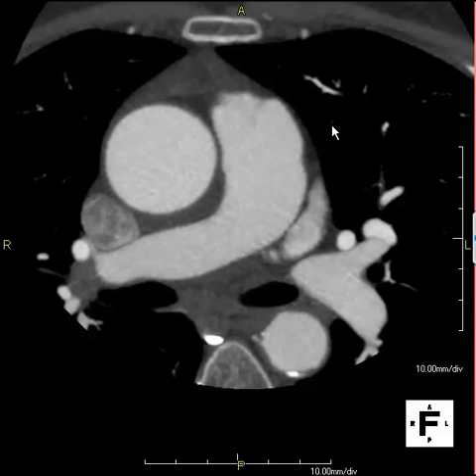This is case L3 Ct A67. The history is that of a 46-year-old woman who has been well during her adult life, but is now experiencing within the past week some accelerating chest pain, now occurring with minimal effort.